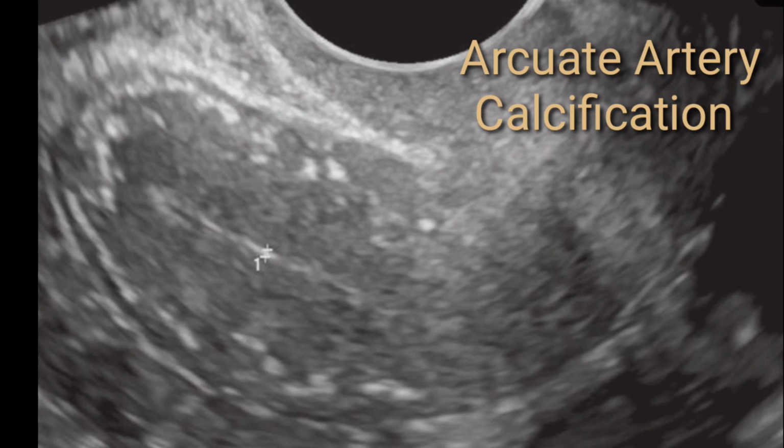So you have to just clarify that, and further correlation with the clinical examination and the patient history is recommended, because if the patient is symptomatic, one should take account of these calcific foci and go for further imaging. But if the patient is asymptomatic and you randomly come across these calcific foci within the uterine cavity and the patient is postmenopausal, then there is no need for further workup, and this is just a normal case. So this was an example for you to have a look at.